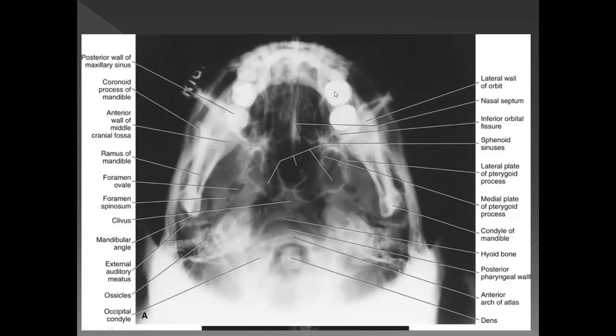All right. So now this is a very ideal, if one would say, submental vertex view. But again, I would stress that since we are doing it basically for a zygomatic arch, in this case you really can't make out the zygomatic arch very clearly.